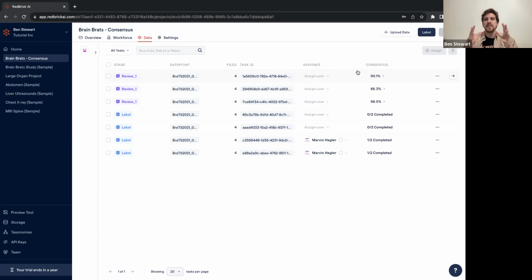You want to be able to look at how people are annotating comparatively the same structures. You can even create acceptance tests by using a baseline set of annotations, uploading them, and setting them to your labelers. And then your labelers will work, and their work will be quantitatively measured against the output of the baseline.